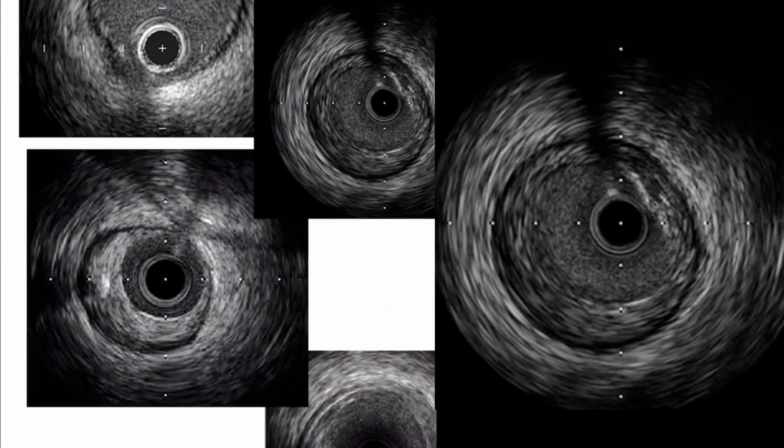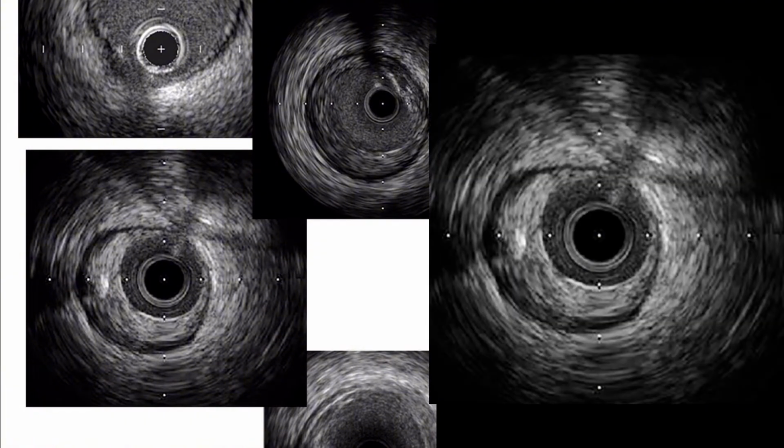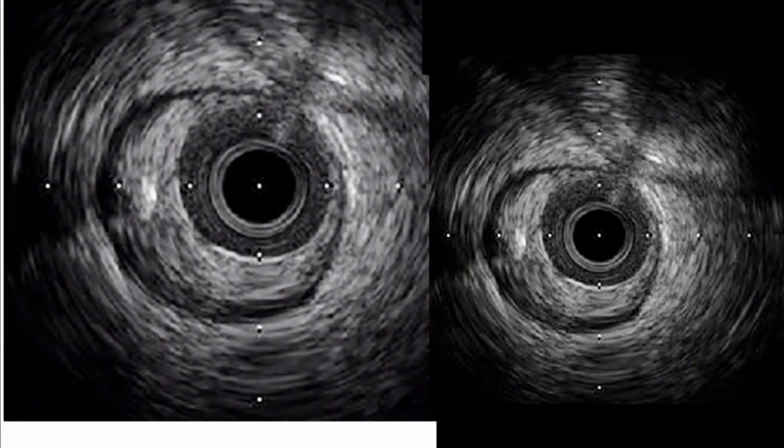Now over here, if you just compare these two images, look at this and then look at this, there's two completely different kinds of textures going on, which we're going to talk about. But remember, we don't skip steps. So let's go from the middle, right? This is the catheter, the IVUS catheter. I do want to be specific on that. And then the next color change, do you see the black area that's about the same texture? If I color this in here, what would that be? What comes right after the catheter? The lumen. This is quite a small looking lumen, but a lumen nonetheless.